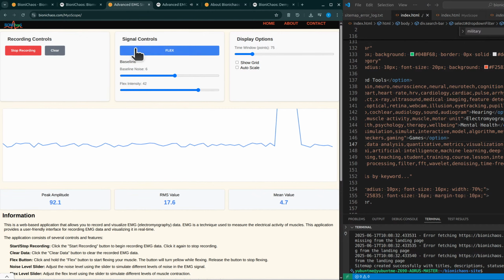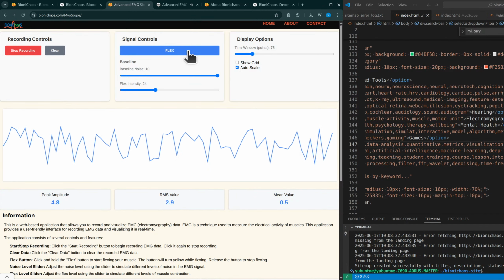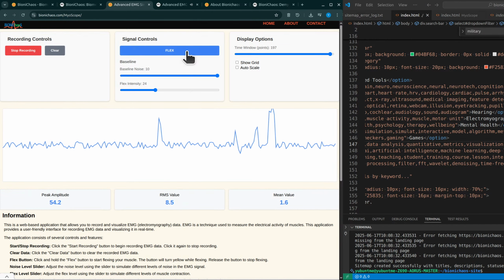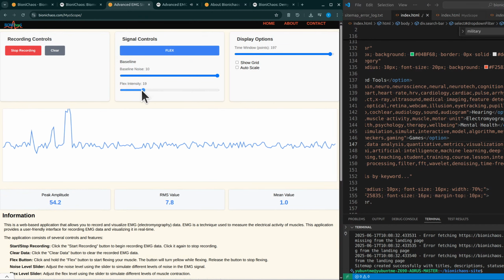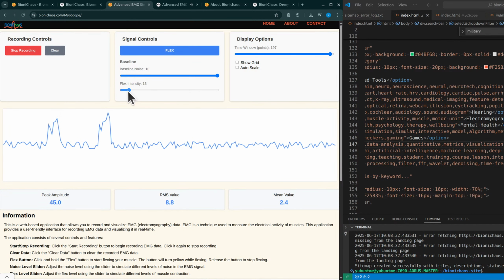Pretty much, yeah. And this source describes a web app, a simulator, built to let you record and visualize that EMG data. Looks like they really aimed for a user-friendly interface. Yeah, making complex stuff approachable. So our mission for this deep dive: figure out the core features, and maybe more importantly, what this simulator actually helps us explore about these muscle signals. Like, what do you learn by playing with it?